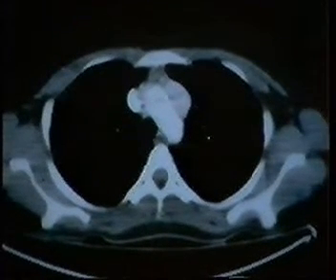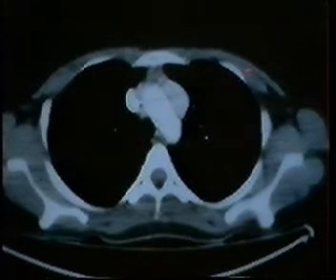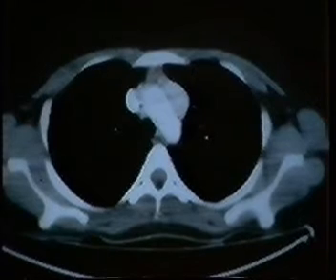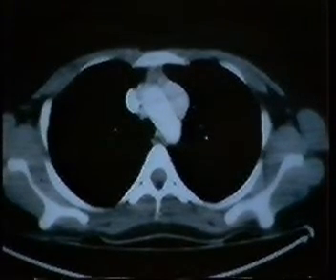From this bolus CT scan with good enhancement of the aortic arch and the SVC, you can see that the mass is also enhancing significantly when you compare it to the adjacent chest wall musculature. And at the University of Michigan, unlike most other places, this is going to turn out to be a pheochromocytoma in the chest because we have I-131 MIBG. This is an I-131 meta-iodobenzylguanidine scan, which localizes in pheochromocytomas.